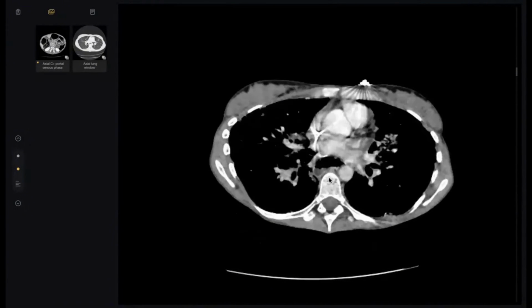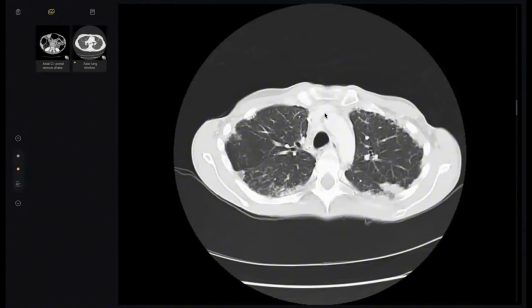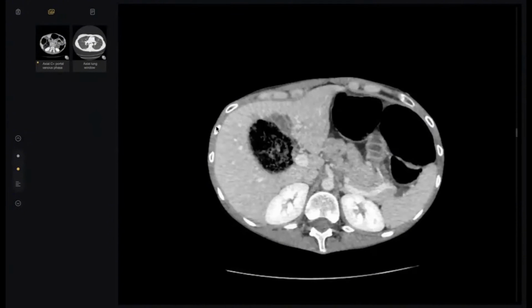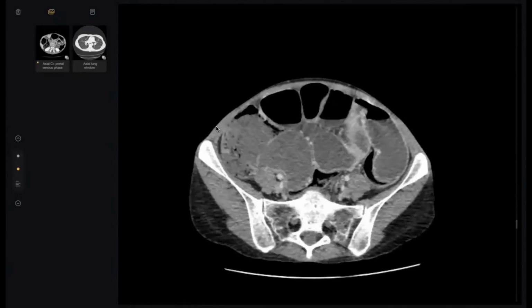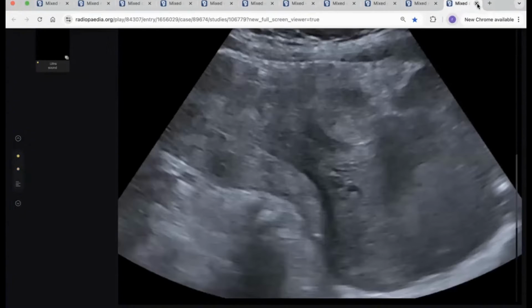Okay, my colleagues, see here. I think no need to explain the chest. All of you know the non-specific interstitial pneumonia here, plus this esophagus. Here is the surprise. What happened here? There is no classic hidebound appearance, but just bowel dilatation. In correlation with the chest finding, it is a scleroderma finding. Thank you so much, doctor. Next candidate.